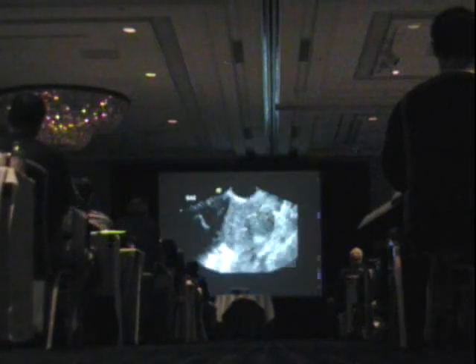So what we do for sonohysterography is a very small catheter is inserted into the cervix in the ultrasound department, and we typically have a gynecologist come down to the department and do that cannulation for us. And then sterile saline is injected through the catheter, and we image the patient transvaginally.